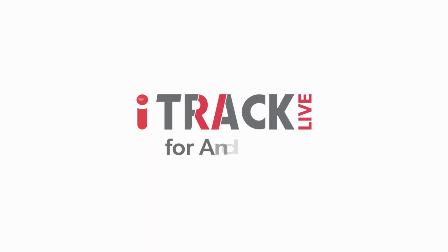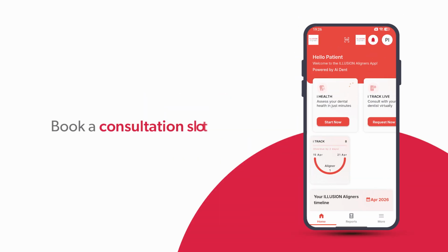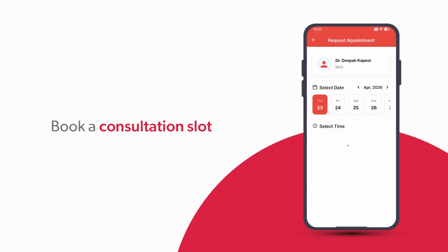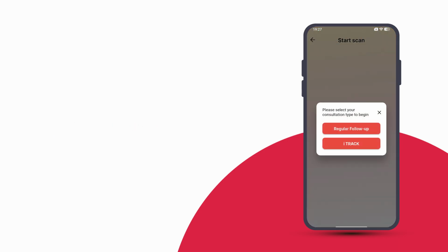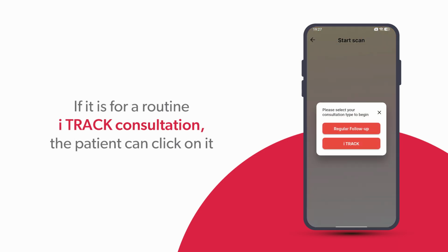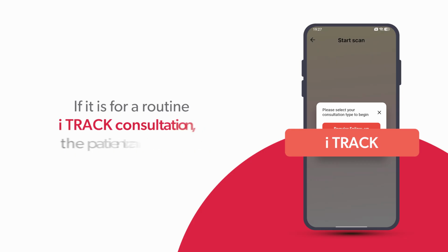Now let's explore how to conduct a TrackLive session if the patient has an Android phone. If the patient is an Android user, they will have to click on the TrackLive and book a consultation slot. Here, the patient will see 2 options: whether they want to book a TrackLive for a regular follow-up or an iTrack consultation.